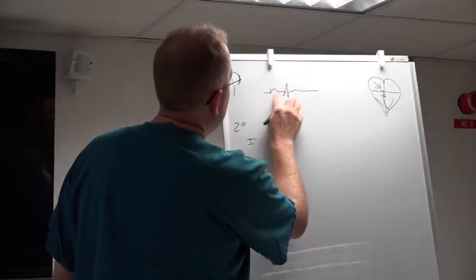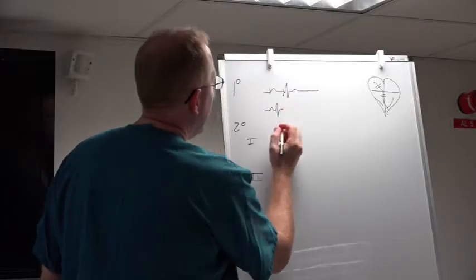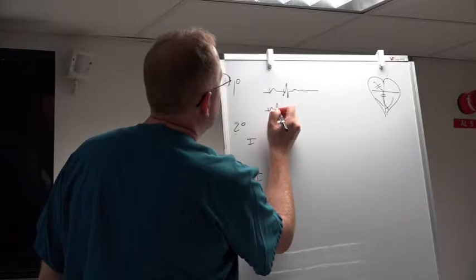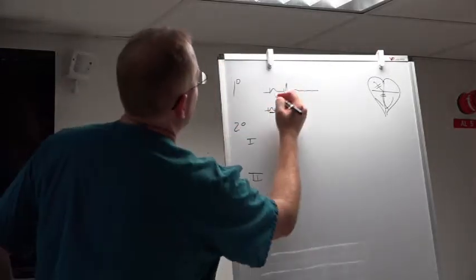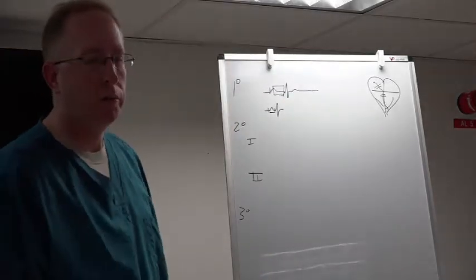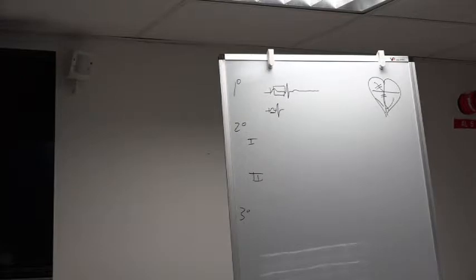So a normal, your PQRS just kind of goes right into that, and so it's within that one big box. But if it's first degree block, maybe it's a little bit beyond that big box. And in your books, I believe this is number 8, the first one there, yeah. And so you can kind of see how it's more than one big box.